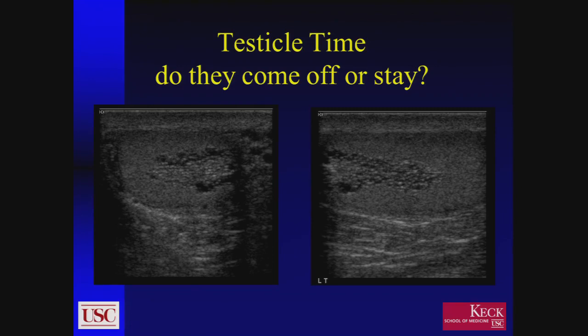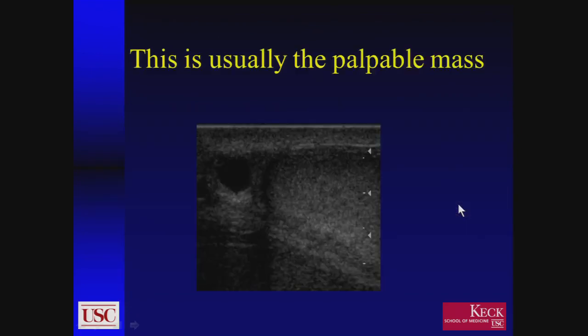Frequently there's this triad of findings in patients with this. You'll see the dilated rete testis. Often these patients will also present with intratesticular cysts, and you may also have epididymal head cysts as well. So the three of them frequently occur together. But again, obviously, as I said, this is a very dramatic appearance, but in fact is completely benign and not something you want to do anything with.